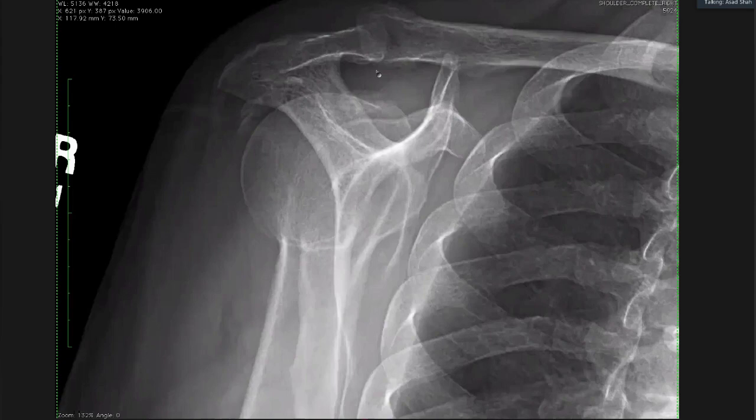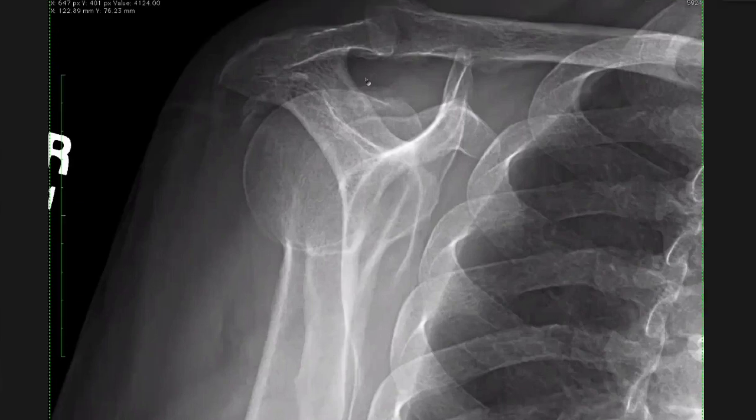So can you tell me which tendon occupies the back half? If you divide the subacromial space into anterior half and posterior half, which tendon lives in the posterior half? So supraspinatus? Well, supraspinatus is in the anterior half. If you got supraspinatus in the anterior half, infraspinatus is in the posterior half, right? The subscapularis is on the front. So by looking at it, you know that this is in the region of the infraspinatus tendon.